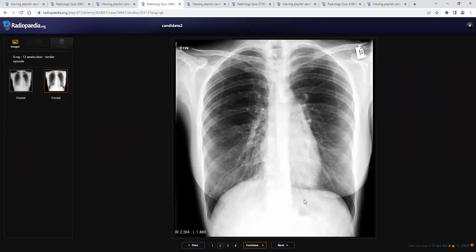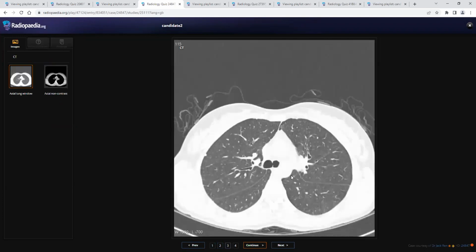Okay, so what do you think is the cause of the pneumothorax? Maybe lung bullae or cystic lung disease. Maybe. Okay, yeah, we are not seeing any bulla or something like that. Again, we proceeded with the CT as you told. So this is the CT. This is the only static image we have. The rest of the lungs were clear. So what do you see?